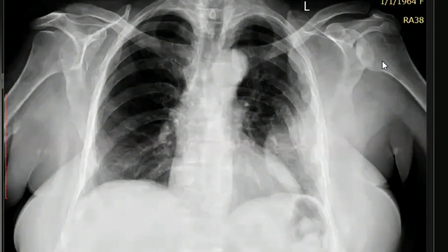It continues above in the form of lobulated pleural thickening up to the level of the mid chest wall on the left. I cannot see any differential density or area of calcification within this opacity. The underlying ribs in this area, the posterior ribs, appear somewhat deformed.